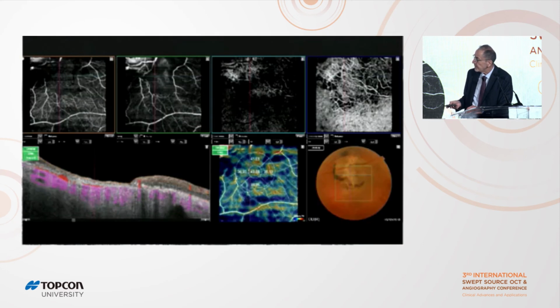And this is the OCTA showing retinal non-perfusion, probably from TTT treatment. And here you can see probably choroidal vessels or intratumoral vessels from RPE atrophy, choriocapillaris atrophy. So there is increased visibility of the tumoral vessels after treatment.